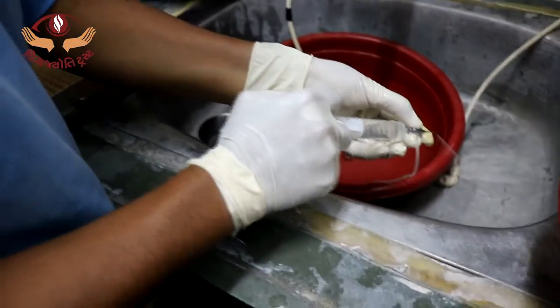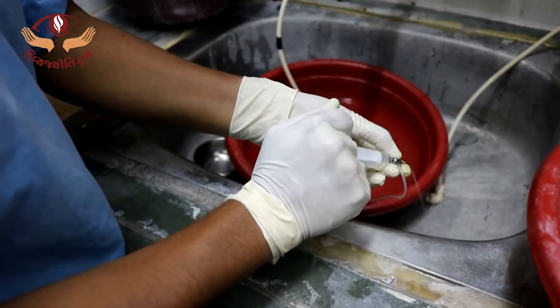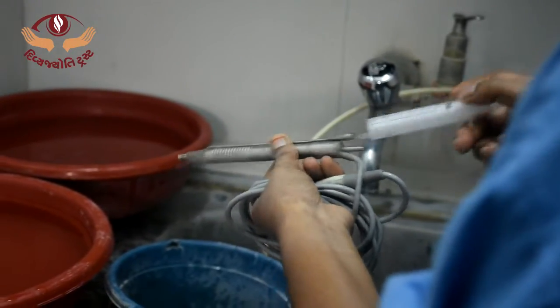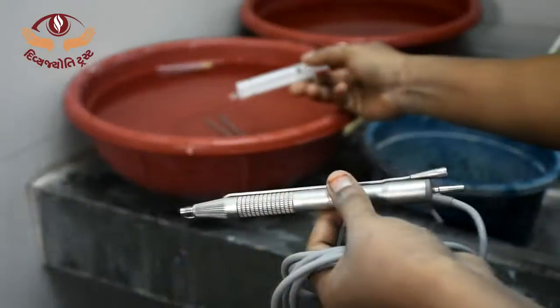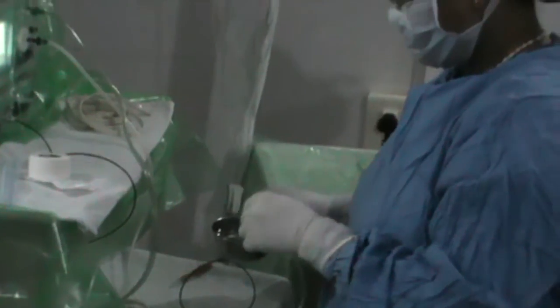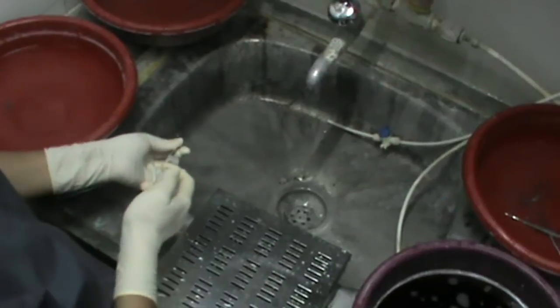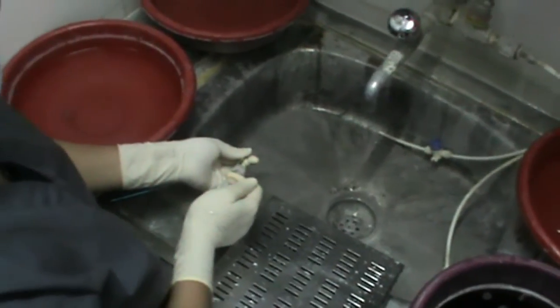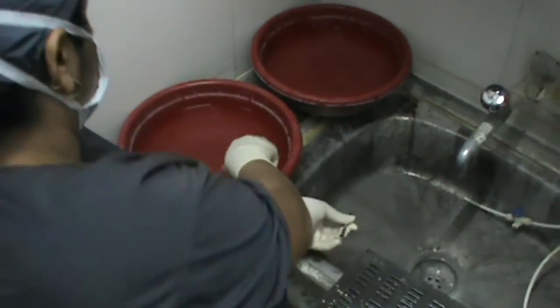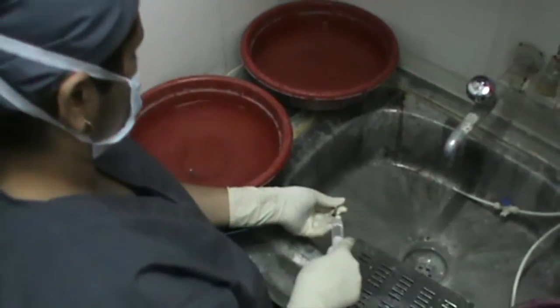Cannulated instruments are first flushed with distilled water 3 times and then with air 3 times before packing. Use a copious amount of water and air for the purpose. Phacoprobe and tubing are cleaned in the cleaning mode of the phaco machine to remove residual tissue and water droplets. Irrigation and aspiration handpieces are flushed thrice with 50 cc distilled water. It is repeated thrice with air to remove water droplets.